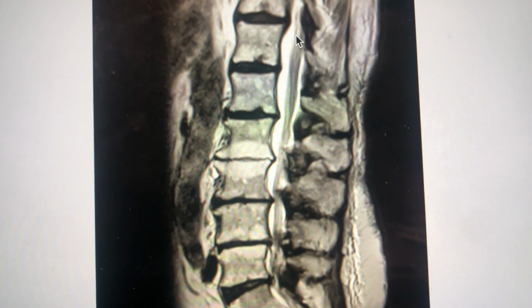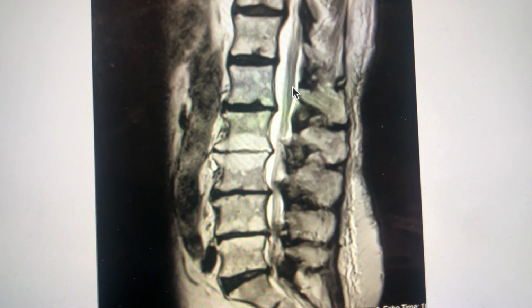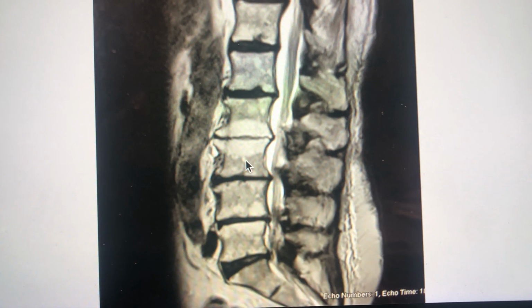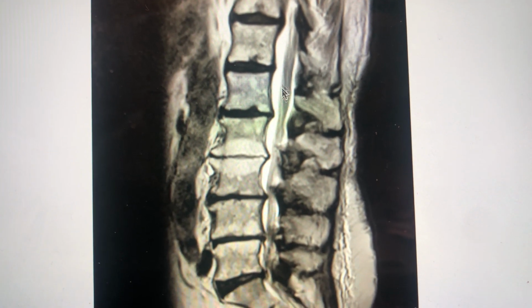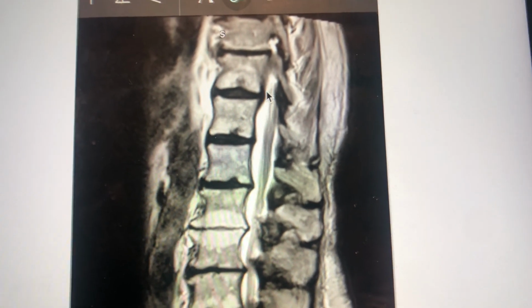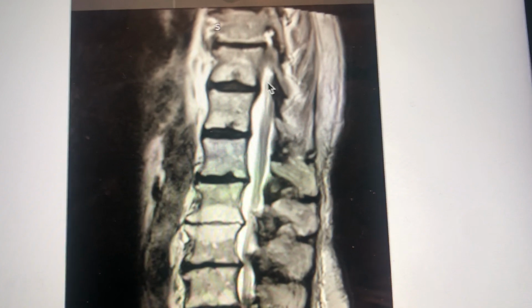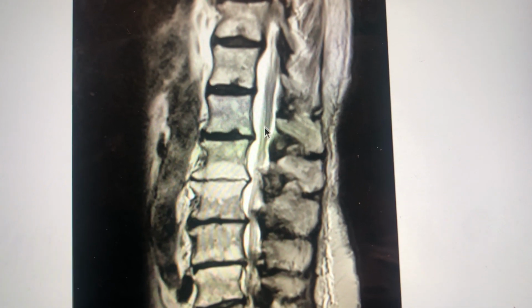If you look back at the neural canal here, you can see it's pretty broad here. Spinal cord ends right about here, in this area here. Let's see. This is L5. That's the top of the sacrum, so that's L5, 4, 3, 2, 1. Spinal cord typically ends at the bottom of about L1, somewhere behind L1. Above that, you see the canal is fairly wide. This looks narrow in this area, but that's because this scoliosis is showing some bony anatomy there, some of the pedicle, which makes the neural canal look like it's not patent and open at that level. But you see it's pretty widely open here, throughout here.